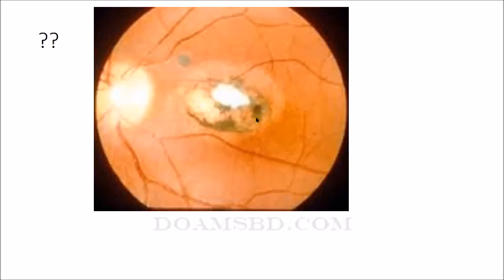But in this appearance, pigmented, there is a white patch. Can you imagine that this white patch could be sclera? Can you imagine? It is possible. This very, very bright white area, the whole choroid is damaged and the sclera is visible. So this is not confined only to the retina. You see the whole retina is damaged. There are no vessels visible. The remaining retina is intact. There is also a pigmentary area.